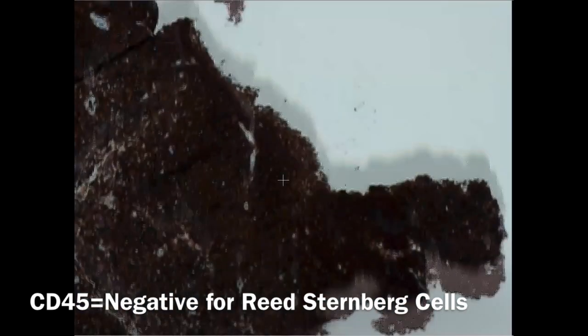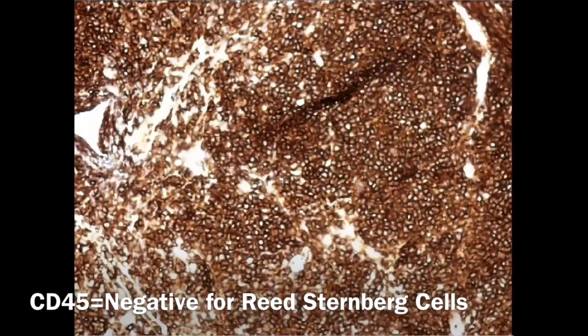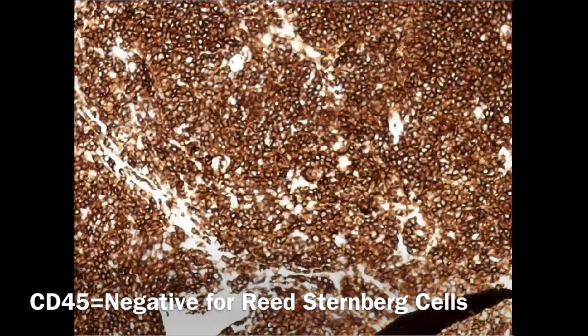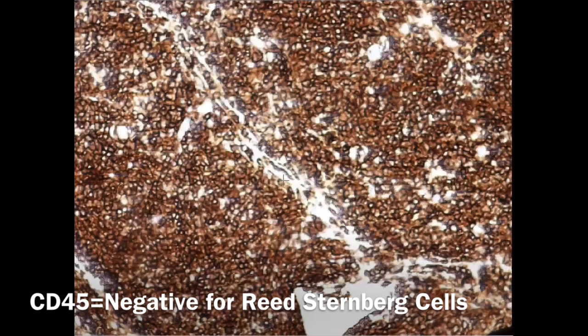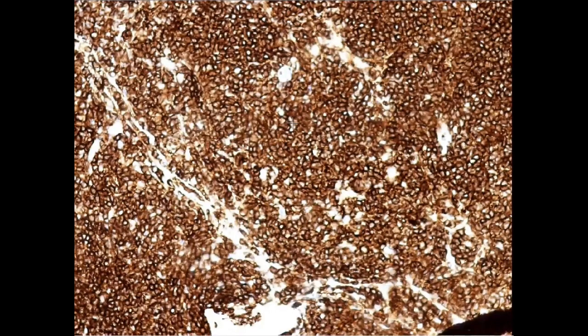So let's go to an area where we can see some gaps, like this area. I'll go on higher power. And we need to compare it with other stains. So I will mark this area. Let me adjust the field. So as you can see, all stained cells, they have this membrane around, which is a sharp membrane, meaning that this cell is being stained, and they are all small cells.